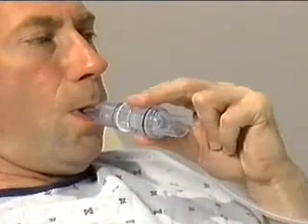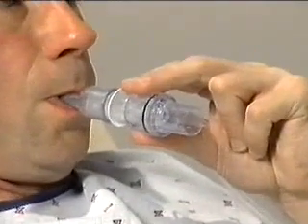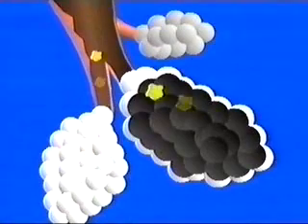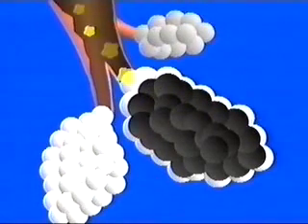Treatment of atelectasis requires collateral ventilation in the lungs. Collateral ventilation through the pores of Kohn and the canals of Lambert results from the prolonged positive back pressure generated during PAP. This allows airflow to enter these channels behind areas of mucus obstruction, keeping the airways open during exhalation. The therapeutic pressure range is usually between 5 and 20 centimeters of water. Let's take a look at how EzPAP works.